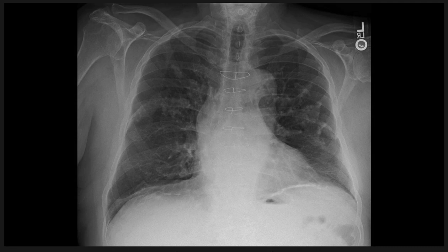Alright, so let's take a look here. And I mentioned before that the degree of calcification is variable and it can change with time. So here we've got some increased density. This would be a lighter version. So take a look down here. Notice how dense that is, a real dense white line there. That's a dense calcification along the diaphragm pleura there.